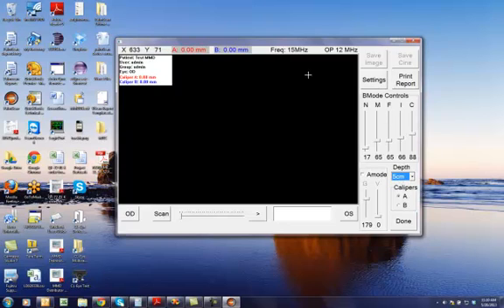So at 5 centimeters, you're running the probe at 15 megahertz. At 6 centimeters, it switches back down to 12 megahertz. So those are the two frequencies we can run the probe at. Those are the modes that it can be run at. The calipers are used for taking measurements. There are two calipers, caliper A, which is in red, and caliper B, which is in blue. They give you the measurements that you can make on the image.